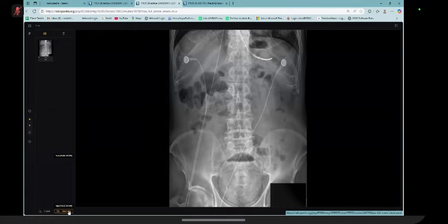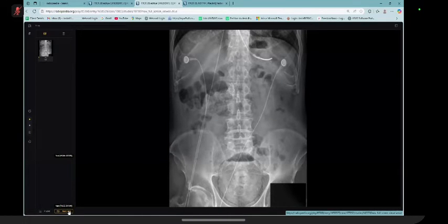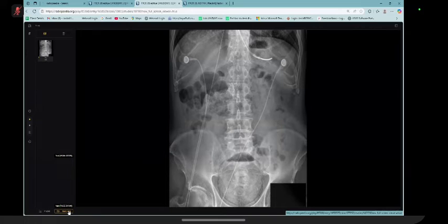For this patient, you just need to pick up the finding and tell me what you think, very fast. A 90-year-old diabetic patient with acute abdominal pain. This is a frontal radiograph of the abdomen. There is gas within the wall of the bladder and also a gas fluid level. So likely this is a case of emphysematous cystitis, as the history is also suggestive. As this is an emergency, I will pick up my phone and inform the referring physician and suggest referral to the urologist for further management.